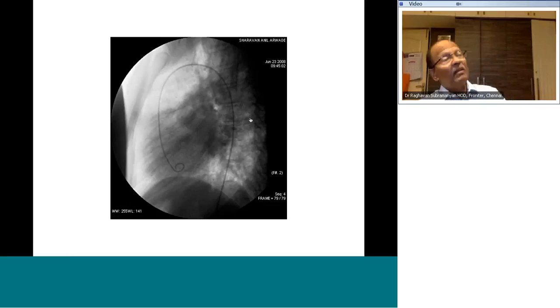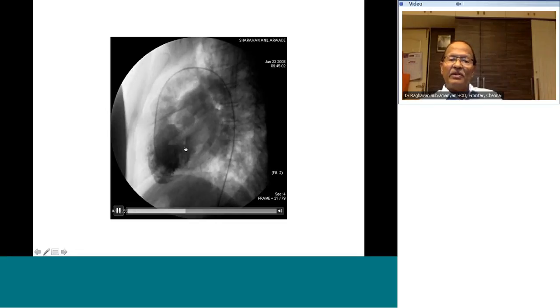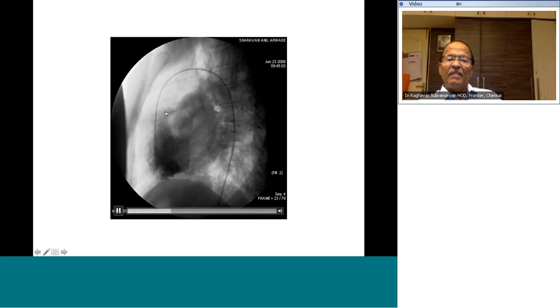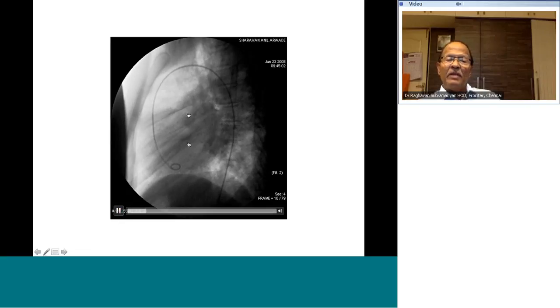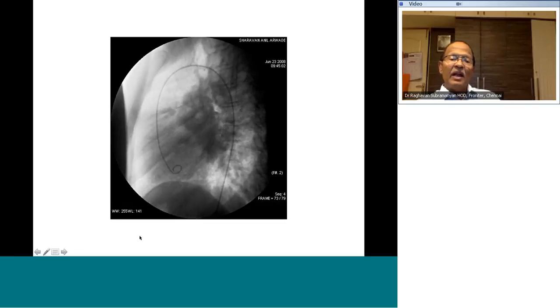Now, a lateral view is a great view for looking at anterior structures. What are the anterior structures? For a right ventricular angiogram, as you see here, the right ventricular outflow tract, and for profiling the pulmonary valve. You see the pulmonary valve here. And the main pulmonary artery, or the aorta, is coming from the RV. This is the aorta actually, not the pulmonary artery, sorry. This is the catheter coming from the femoral artery going into the RV. So either the pulmonary artery or the aorta, whichever is anterior, a lateral view is a good view to outline the anterior chamber and the anterior great artery.